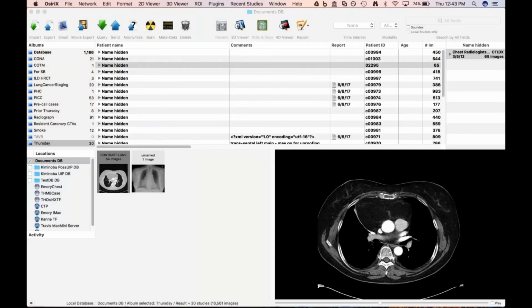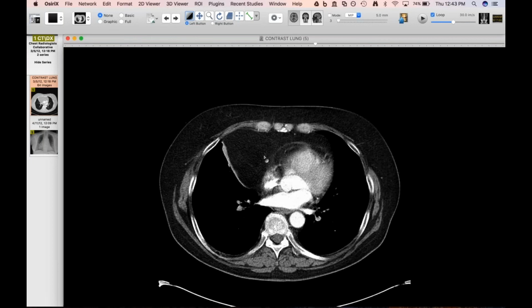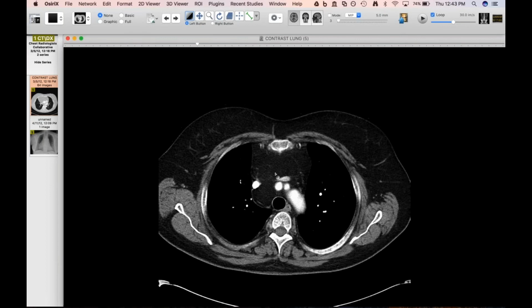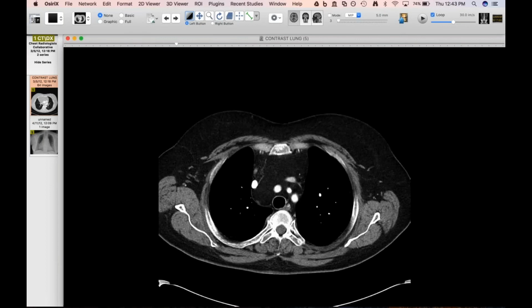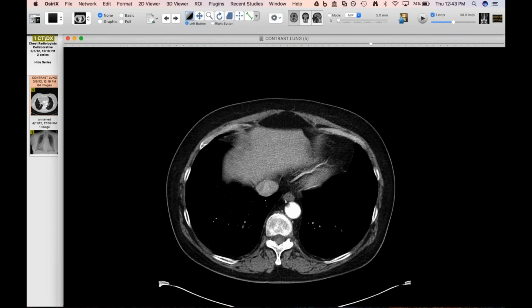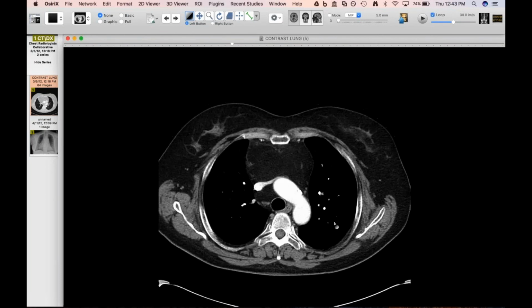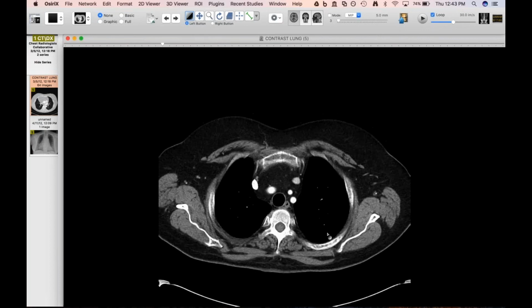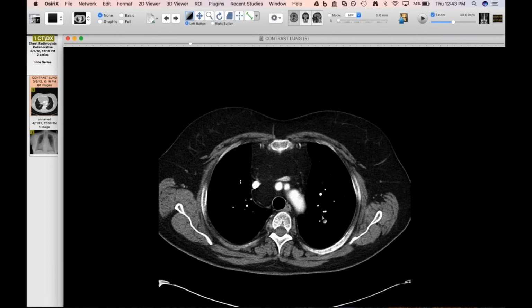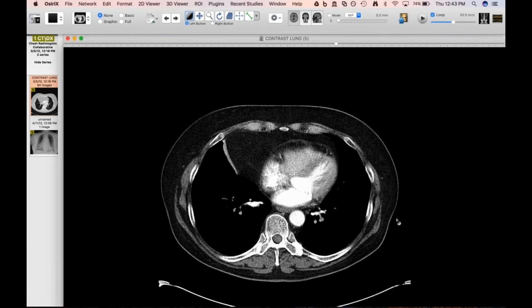Here's the one that Jeff showed a few years ago, which has even less soft tissue component to it, but almost identical in the sense that it's involving the anterior, a little bit of the middle mediastinum, and just kind of insinuating along everything else. So the challenge is still out there for somebody to show me a path-proven thymolipoma. I looked through Jeff and Howard's databases, and I still don't see one on there either. So has anybody actually seen one?